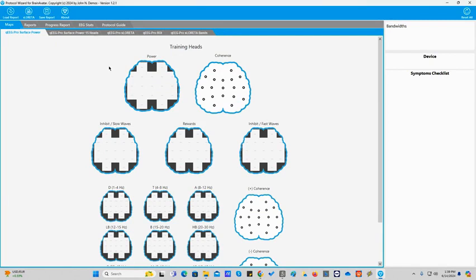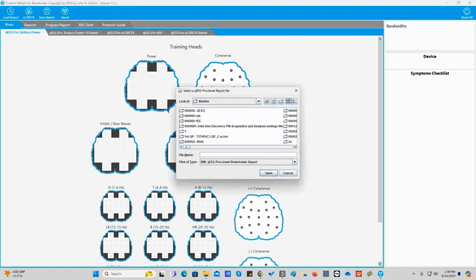Now that we have learned how to acquire QEEG, how to edit the file, how to create an analysis report, let's process the analysis report with the PW editor. So load report. Load QEEG Pro Z-scores. That's what we're actually doing. We're loading QEEG Pro Z-scores and creating brain maps from them.